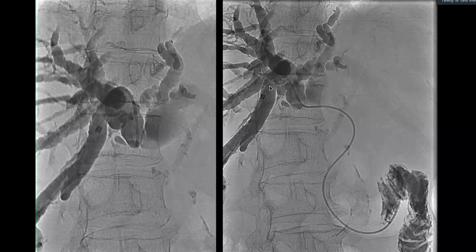This might be due to stenting, because I can't appreciate the clear margins of the CBD or cystic duct. But on the other hand, if it was a post-op case, I might be able to appreciate any T-tube, which usually we have in the post-op.